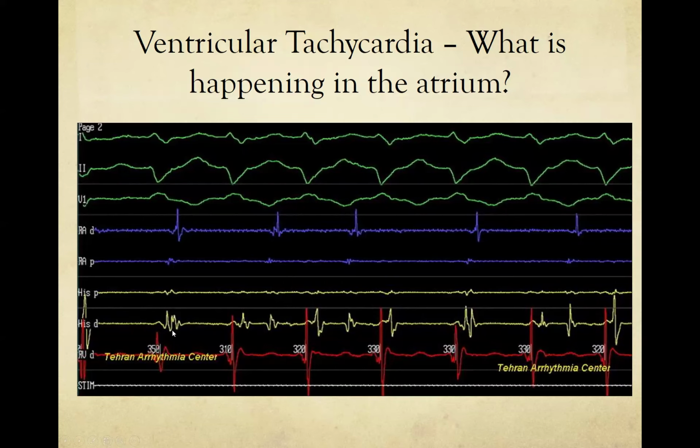To some degree, it's a little bit of a guess. This is one of the things you've all seen me trying to teach Jack how to do. It's one of the harder things to learn when you're first starting to read signals: where does one end and the other begin? But it's a nice example of how, if you have the separation of the electrograms, you can then look back at an electrogram where they're very close together and make a guess as to where it is.